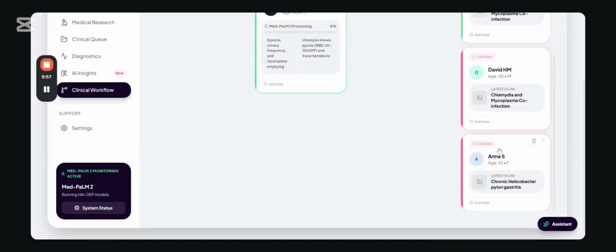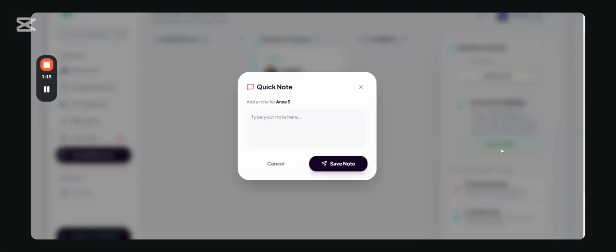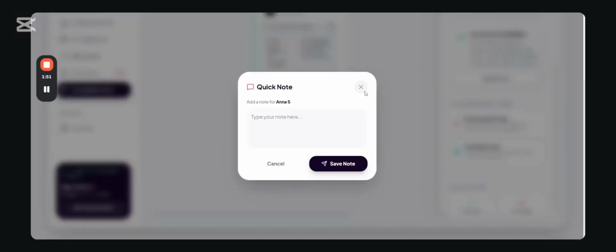Then this is our previous one in which we created. The AI workflow always takes an action, thinks and looks around the user to determine the action. This is where we can submit an order or take notes. Then you save the notes and you can still choose to wrap it up, or you click notes and work.